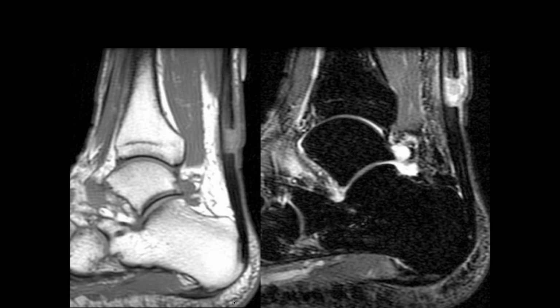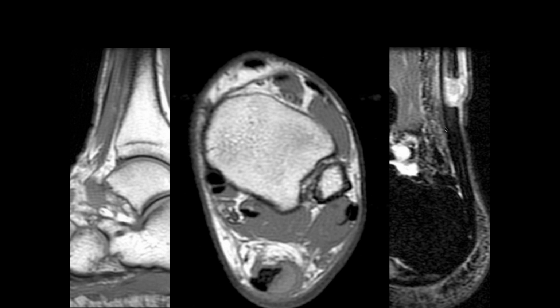Okay, so there's a pretty well-defined defect in the posterior aspect of the mid-distal Achilles tendon with maybe a few intact anterior fibers. This makes it look like it's kind of transected vertically. How do you think that happened? Was there a history of a laceration, or is this something else? It doesn't look like it got torn. Yeah, the edges are very sharp. I think it's a good idea to think about laceration.